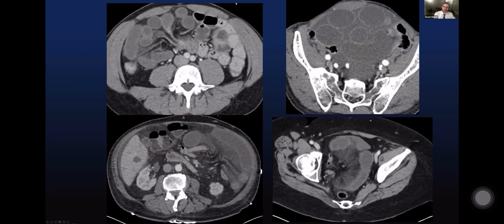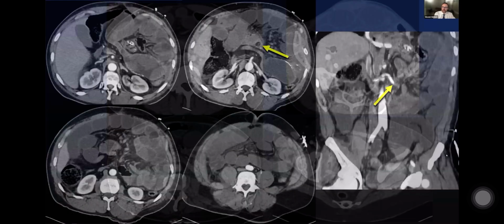Again, some people think this looks like a bag of bowel, where the bowel is sort of so clustered that it almost looks contained. This looks sort of like a smiley face. I'm not really sure why that happened, but suffice it to say the patient probably wasn't very happy about this severe small bowel distension and mesenteric edema. Again, fanning radially distributed loops of small bowel in the left mid-abdomen, lots of mesenteric edema. Similar situation here in the pelvis. Again, you can almost sense that sort of tethering of these obstructed bowel loops at one point in space.